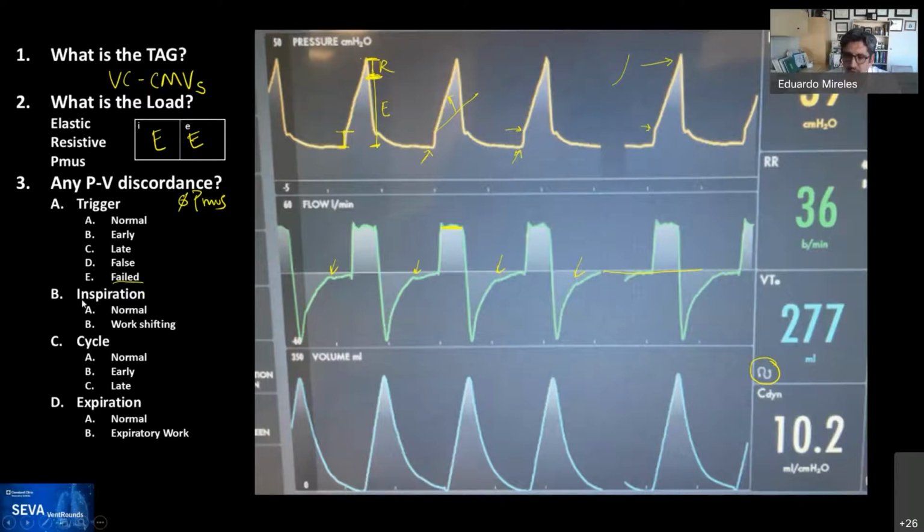There's a dip in the flow below baseline. Right here. What would cause that dip in the flow in that first waveform? Because my first instinct is the patient's drawing in on flow right as inspiration starts, to the right of where you're looking. Right there. Yes. So if he was trying to breathe in, then this should cross up. Oh, okay, that makes sense. Yeah. So anything below that is air going out.